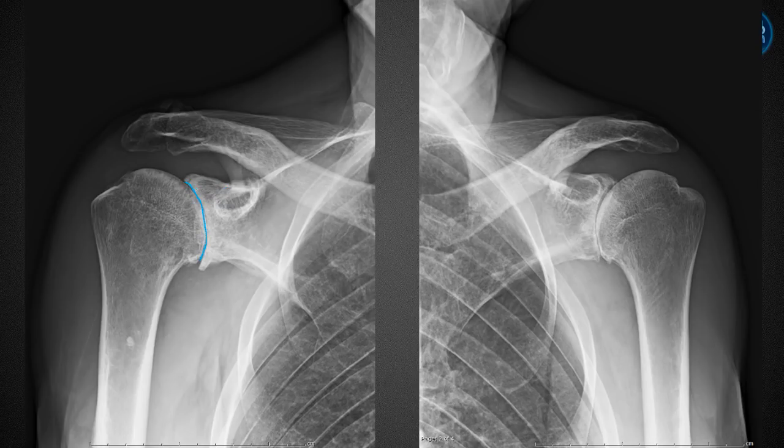So they have some inflammatory joint disease destroying this. Looks like they even have a little sclerosis of the humeral head. I'd be a little suspicious of AVN, especially if they're on corticosteroids in this case. Looks like they have a little pec major insertional calcific tendinosis. And again, uniform loss of joint space over here. So this tells us they have an inflammatory joint disease, most likely RA. AS could do this too, I suppose. You need to see their spine, and their wrists as well. But yeah, this is inflammatory joint disease in the shoulder. This is what it looks like.